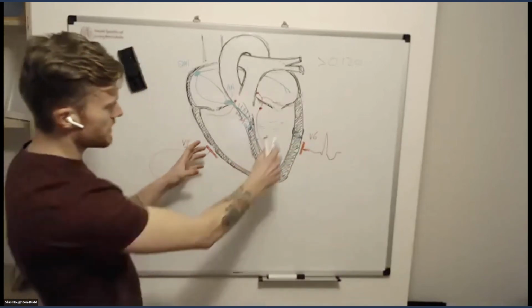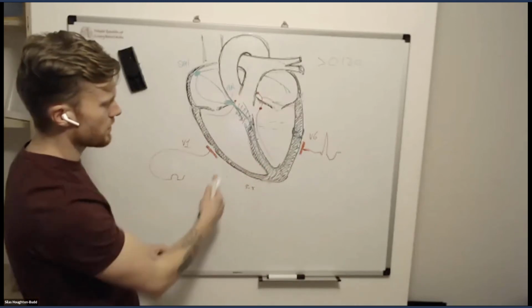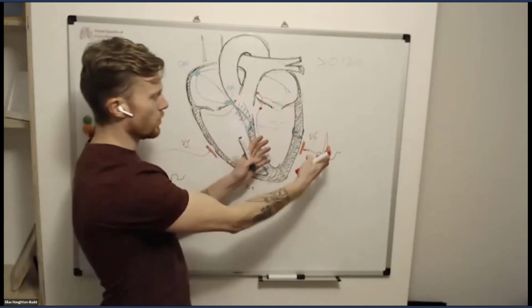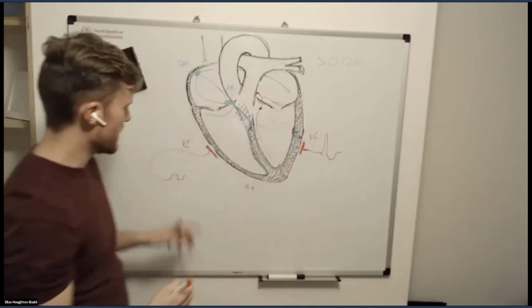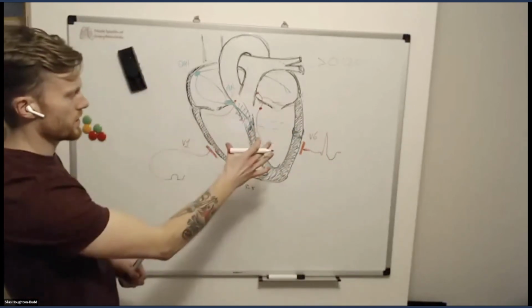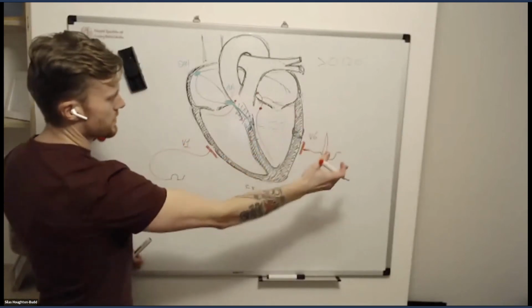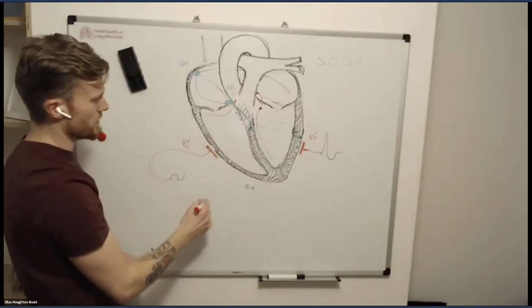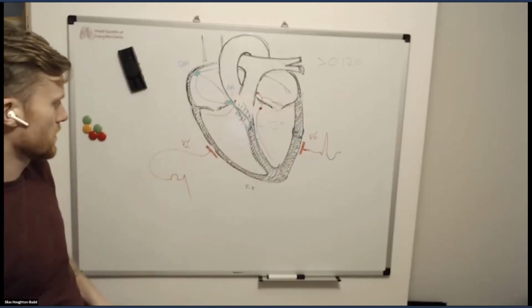And again, because the left ventricle is bigger, although there's probably some energy starting to occur in the right ventricle, there's a lot more in a greater amount of tissue. And so what we see, even on V1, is that occurring. And because the electricity is going from the endocardium to the epicardium and away from lead V1, we see a big, deep S wave in this lead.